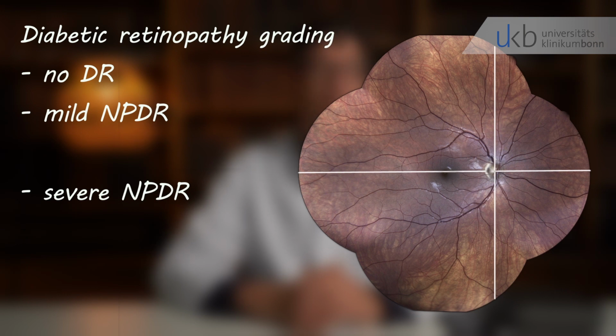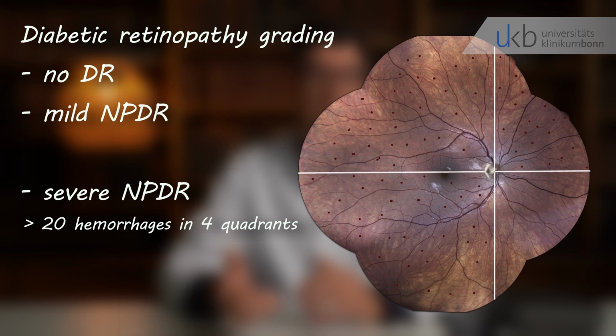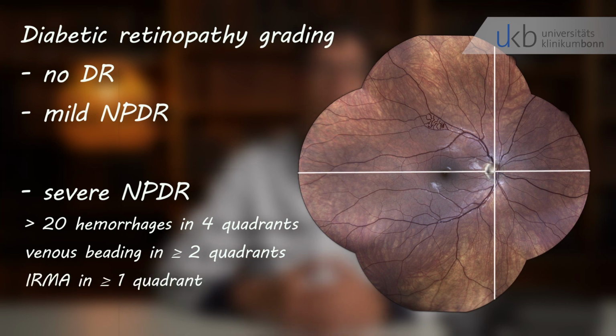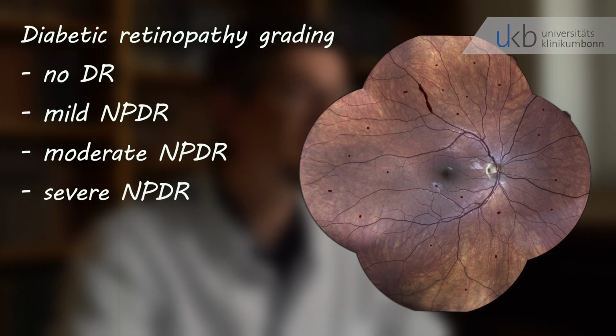It is a severe non-proliferative diabetic retinopathy if there are any of the following signs: more than 20 intraretinal hemorrhages in each of the 4 quadrants, so temporal superior, nasal superior, temporal inferior, and nasal inferior, venous beading in 2 or more quadrants, or prominent intraretinal microvascular abnormalities, abbreviated IRMAs, in 1 or more quadrant. You can remember this with the 4-2-1 rule. If you see intraretinal hemorrhages or venous beading, but not enough to diagnose severe NPDR, it is moderate NPDR.